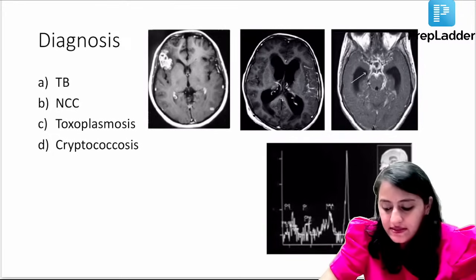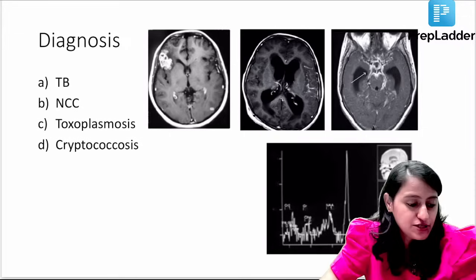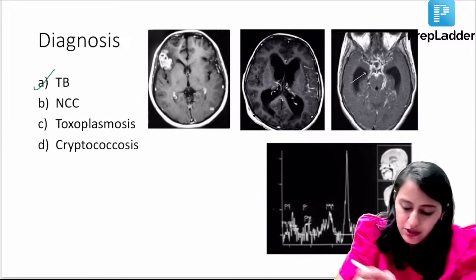What is the diagnosis here in this case? All the images are pointing to the diagnosis. Very good. This is TB. How do we know? Very important.